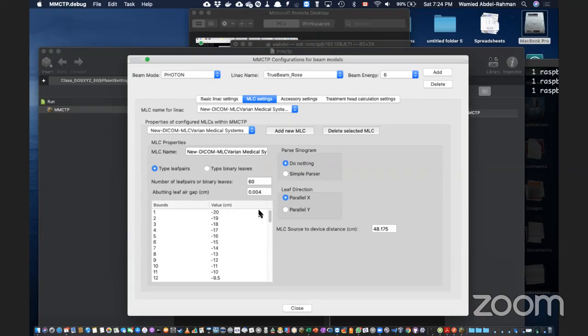And yeah, I'm not sure about the sinogram. I don't know if this is for a different system. When Andrew is here, we can ask her about these things, okay? Sinogram is there in tomotherapy, I think. So tomotherapy, they have sinograms for the MLCs. Yes. Okay.